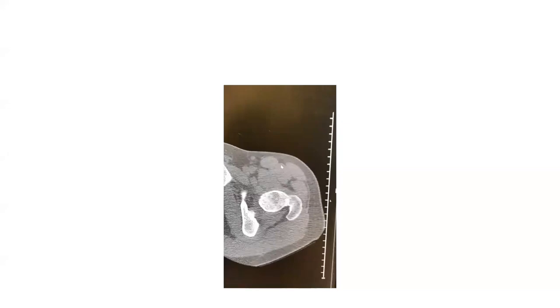Okay, so axial is what we used to have, but with post-processing, now we can get coronal and sagittal recons that are pretty accurate. And it can give you a lot more information than you can get from just a plain film. But it doesn't mean you don't take plain films. Plain films add value. Each modality adds something different.